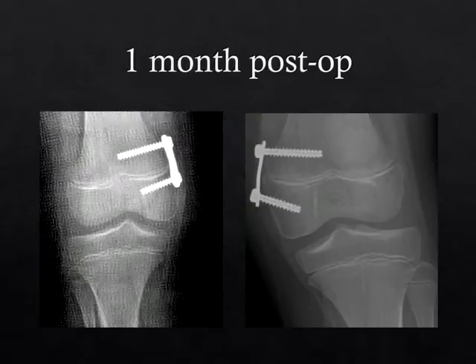So post-op, there's not much to see. They put in her medial 8 plates with screws to try and shut down the medial aspect of that physis and correct the genu valgum. And then on the right side, where she was habitually dislocating, they did end up doing a patellar tendon transfer. So they moved it over about 100%, or about a complete width of the patellar tendon.